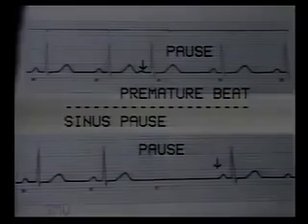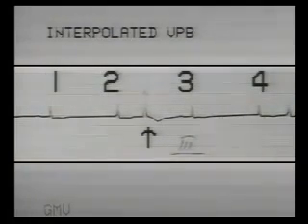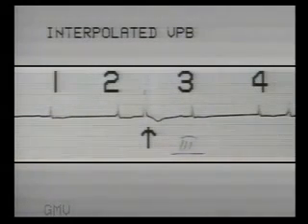Now before we conclude this chapter, we must see two more peculiar ectopic beats. Here the arrow shows a ventricular ectopic beat. But if you study the normal QRS complex rhythm, it is unaltered. That is, this is an extra beat in addition to the normal sinus rhythm. Till now we saw that the sinus beat following an ectopic or premature beat is missing.